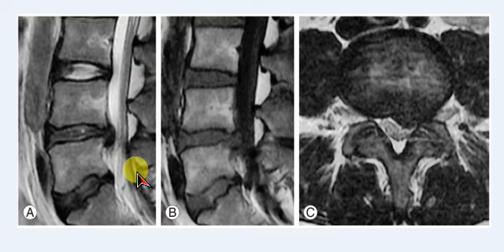Now anterior to this is the dura mater. This black line is basically your dura mater, and anterior to this black line you can see this horse tail like appearance. This is basically the cauda equina, and this white structure is the CSF, and then you have the anterior thecal sac. So between the posterior thecal sac and anterior thecal sac, the white is the CSF and the gray is your cauda equina, which is a collection of nerves, and anterior to that is the posterior longitudinal ligament, which is blended with the anterior thecal sac, and the vertebral bodies.